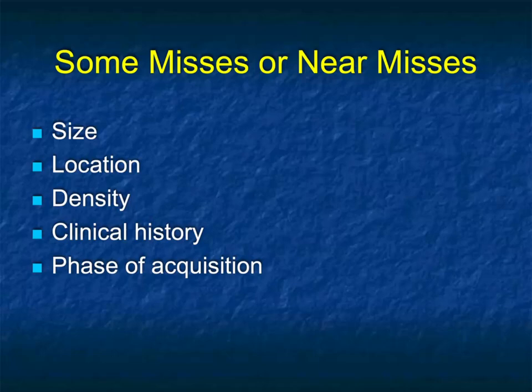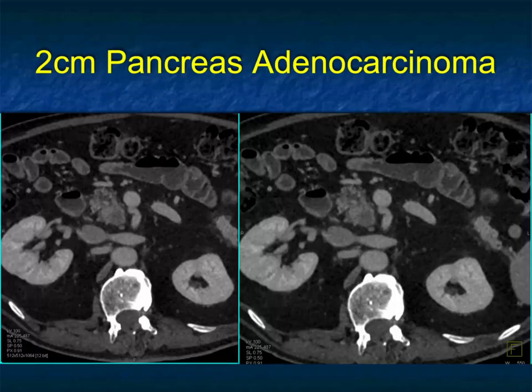Patient may have vague abdominal pain, or maybe the patient was getting a CT for trauma, or for kidney disease, for hematuria, stone disease. We need to look at every case as if it could be pancreatic cancer. Give an extra look at the pancreas. And of course, that's the reason why I think AI is going to be very strong, because it can look carefully at the pancreas on every single case. And I know we're all very busy, and so we don't routinely do that. So let me now show you a number of cases.